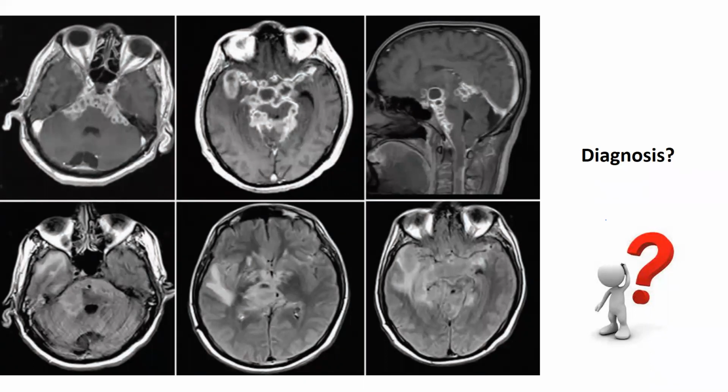Anterior part, basal exudates, sir, basal region of the brain and the basal ganglia. So in and around the brainstem, it is affected. There are basal exudates, and you can see ring-like lesions also. Yes, sir. So this is the first ring. TB, tuberculoma, sir. So this is a patient with TB meningitis.